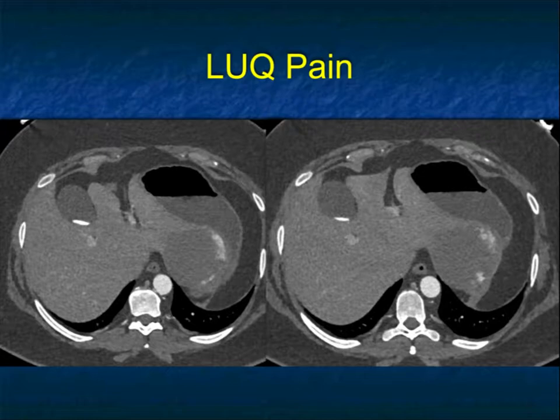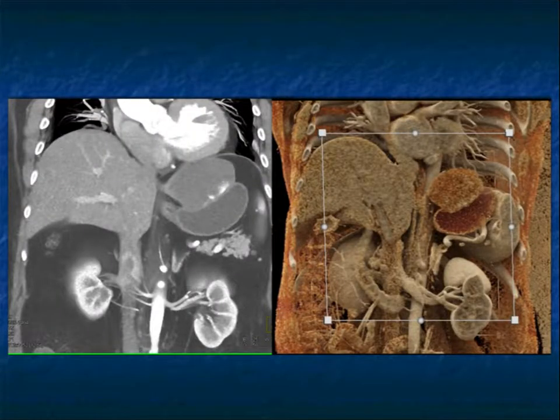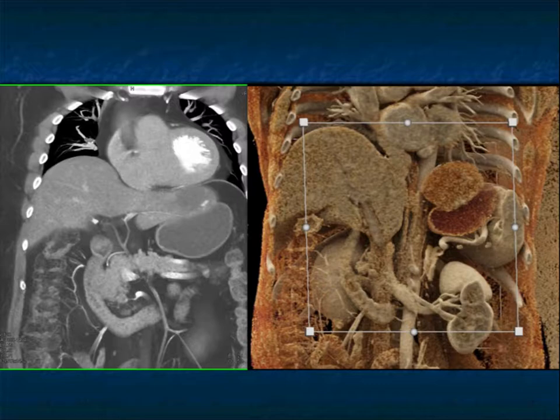Again, it almost looks like a GIST tumor coming off the stomach, but it's simply an enlarged left lobe of the liver with a mass pushing on the stomach. But that peripheral puddling made you know that it wasn't a GIST tumor and it was a cavernous hemangioma. There it is very nicely showing you that same case on the cinematic renderings, really nicely there, the solid mass. Okay, just a really great pitfall. And I've seen this several times, so you want to be careful.